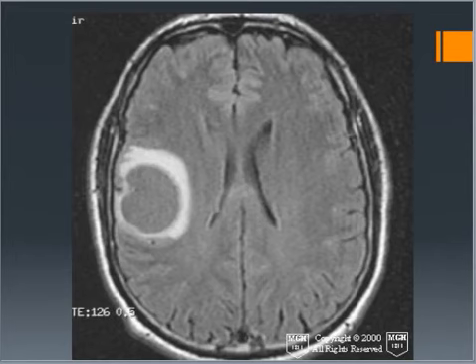So this patient has a mass in their brain. There is contrast around there. That's what this white is. If the contrast is just surrounding the mass like this, that means the mass doesn't usually have blood flow, which is usually an indication that this is just a cyst. If contrast is filling the entire mass, that means it has blood flow, which is usually an indication of cancer.